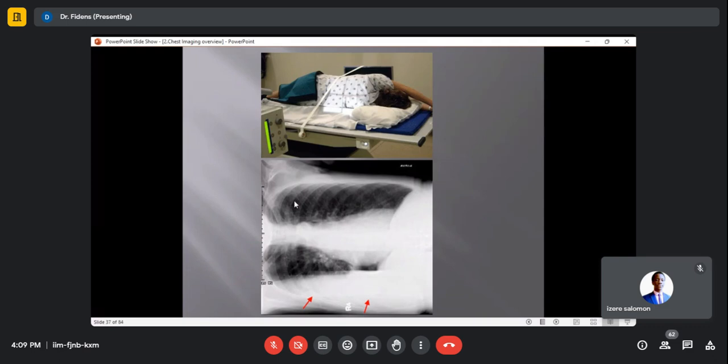This is the positioning of lateral decubitus. Which lateral decubitus is this? This is right lateral decubitus, and I know very well the reason why they have done this. What do you think is the reason? Can you see that the patient is lying on the right side and the X-ray source is behind him, either behind or front? You can choose. This is behind him. Can you see the source here? Yeah, the source is behind. So tell me the reason why they have done this.